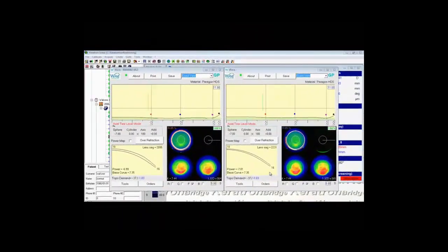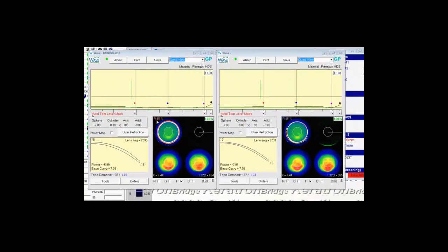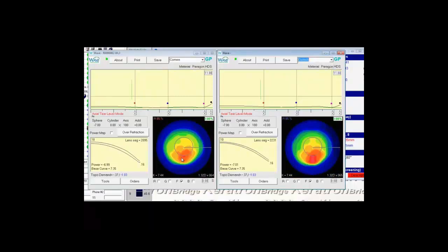And here I have an example of a topography where I selected to average astigmatism data, and one where I selected to not average astigmatism data. So you remember the red means data is averaged, blue means it is not averaged. All else is pretty equal. I just designed a duplicate lens with one set of data averaged, and you'll notice as we look at the cornea as it came in to the topography, when it's averaged, everything is just a little more blended.